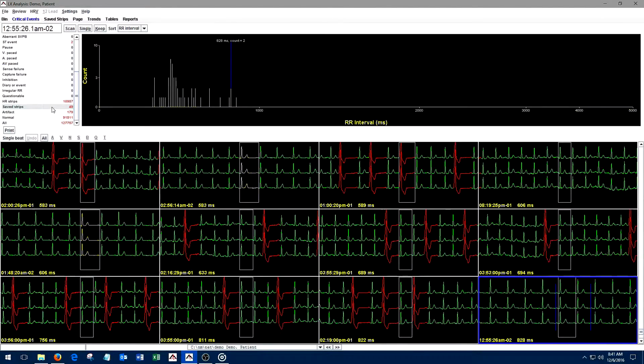Changing the amount of time displayed. The display field controls the amount of time that appears in the single event display. Click on the arrow in the field to show your choices, and click on your choice to change the amount of time displayed.